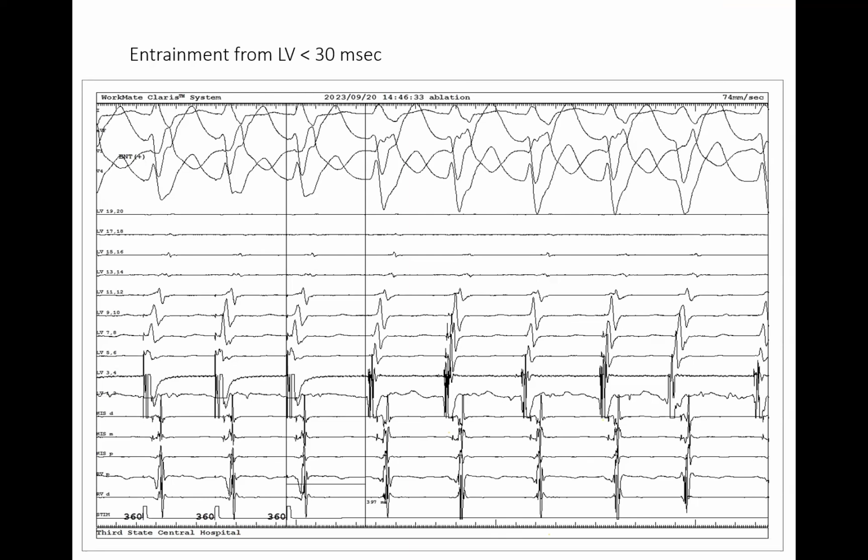Yeah, so you all the area all together. All the that's it. HV is exactly the same as during the tachycardia and during the pacing. Okay.